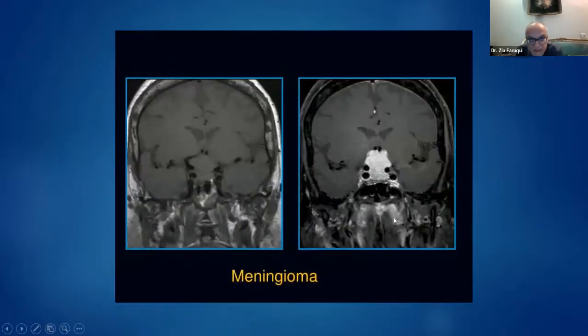And again, another case, slightly more difficult. This time there is some constriction laterally. The artery is not pressed, and you can see its homogeneous enhancement. So really, it could quite possibly well be a pituitary macroadenoma as well, and this ended up to be a surgical diagnosis. Hard to make the distinction always.